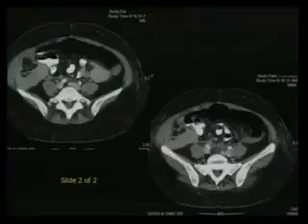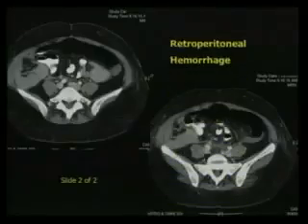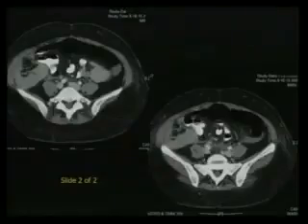So what would you do? CT him. And look at this thing, pushing that cecum and the ascending colon. This was a huge hematoma. I think they may have been on blood thinners, and just minor trauma can cause big time bleeding. But get this, here's the descending colon. The ascending colon should have been about the same level. This is too far medial.